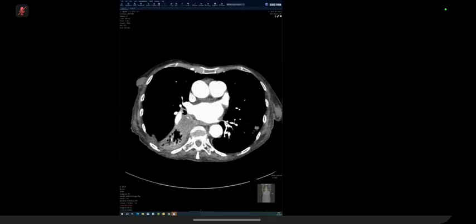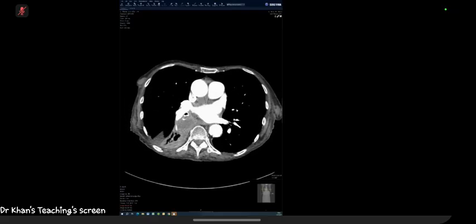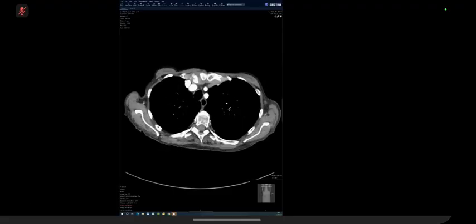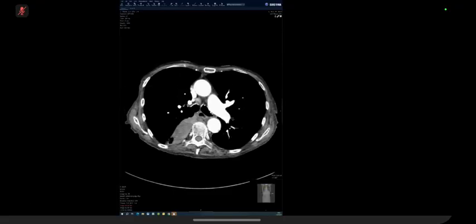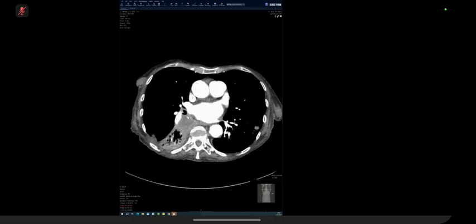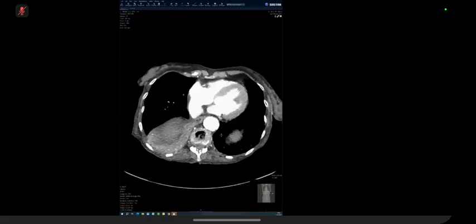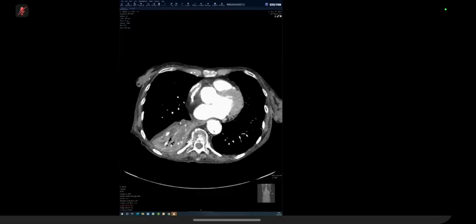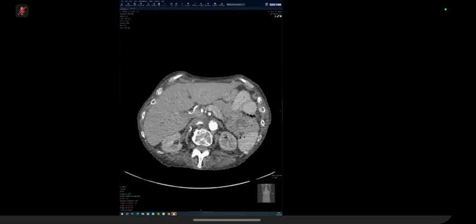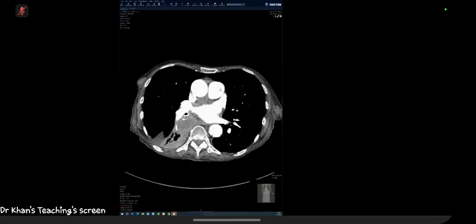Okay. Yeah. Thank you. Once you call that a primary, you then have to say nodes. For central lung masses, you have to look at the SVC, because those are your urgent life-threatening findings. Lung cancer, you have to look for the Brownie points: the incidental PE, the SVC obstruction, intracardiac metastases. Those are the ones that will get you the maximum marks. Because once you're on a CT like that, picking an abnormality isn't exceptional. It's getting all the things right, and there will always be little things on the case that will take you that extra mile to get you full marks.